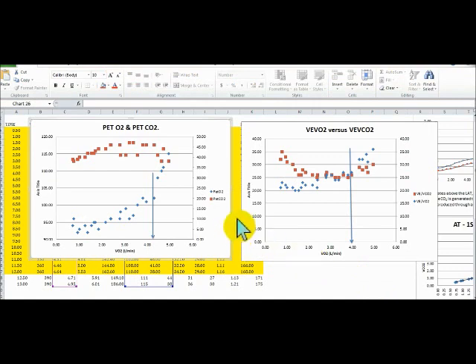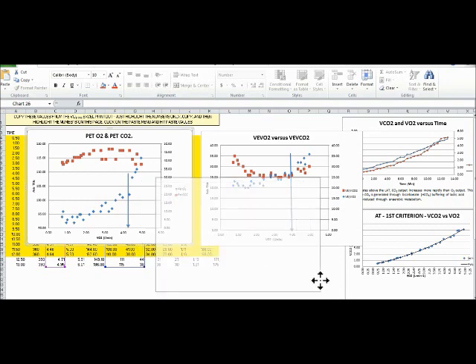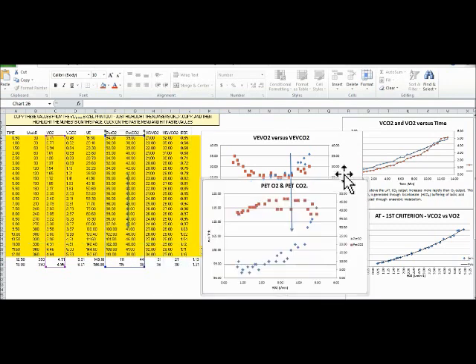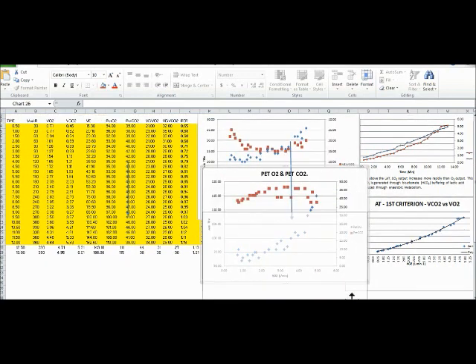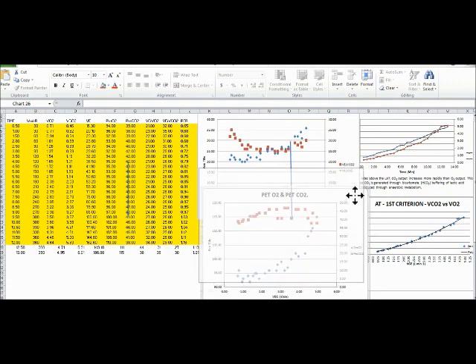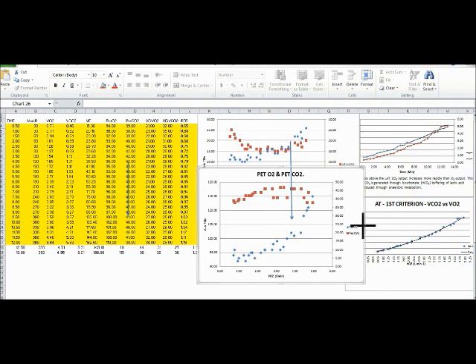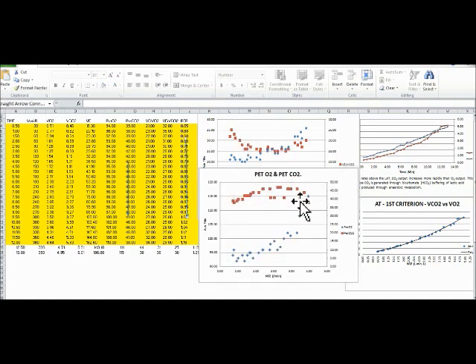Now, one thing we can do to help us out just a little bit, because it's kind of difficult to do this just by eyeballing when the values are so different, is place the graphs above one another, like so. Make sure that the scales are similar. So crop that down a little bit. Let's get rid of the line for now.